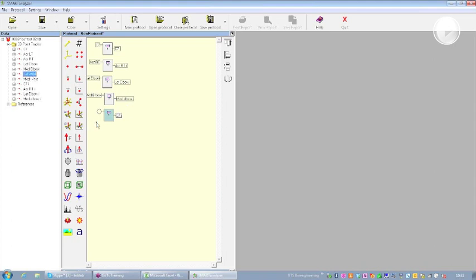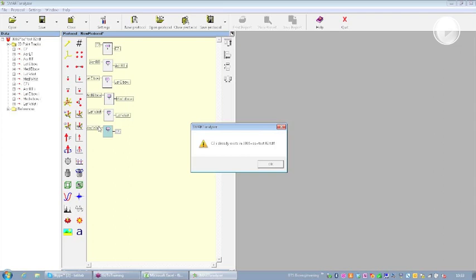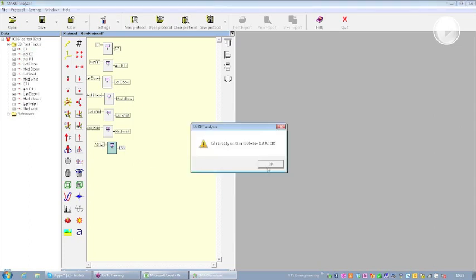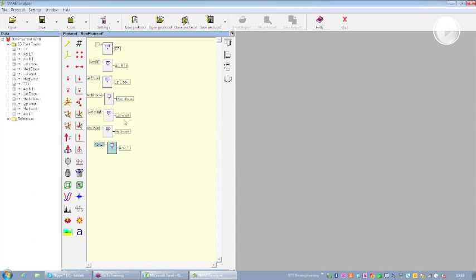Lateral wrist, and medial wrist. I missed just one marker, that is the acromion on the left side, and I will put it here, acromion left side interpolated.